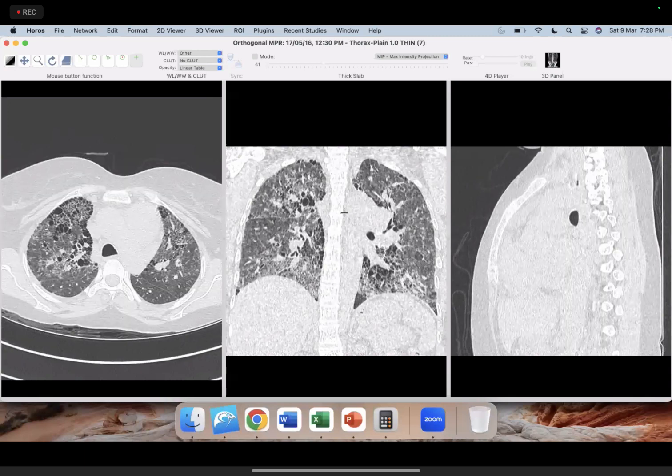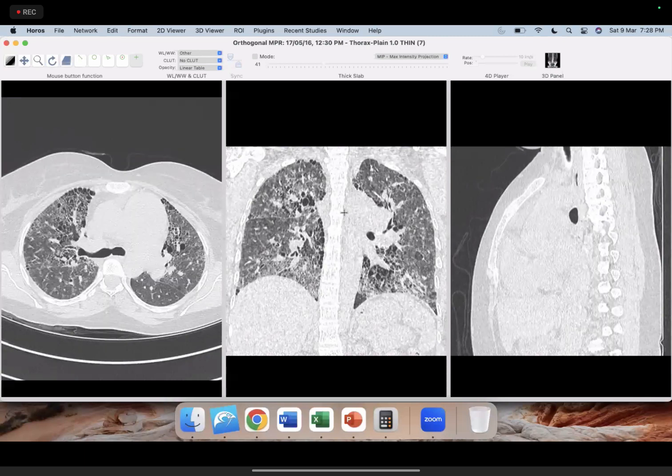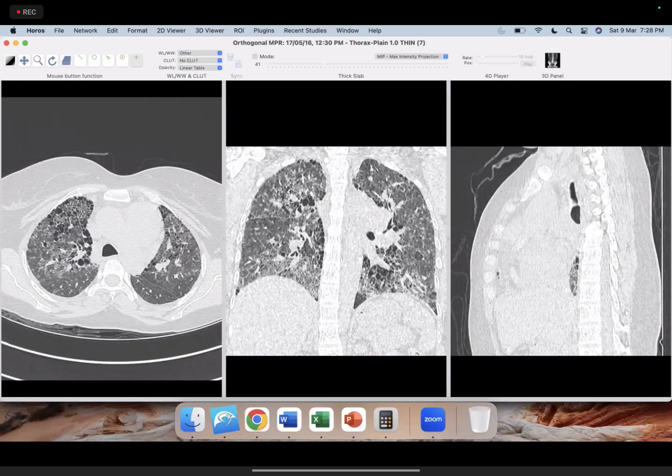Many times what I've seen is the moment you see honeycombing, your thinking stops at UIP pattern only. Like I have already shown, honeycombing can occur in a UIP-like pattern of CTD also, which is not IPF. And these are a couple more examples to say that UIP is not the only place where you see honeycombing. So now let's analyze this scan.